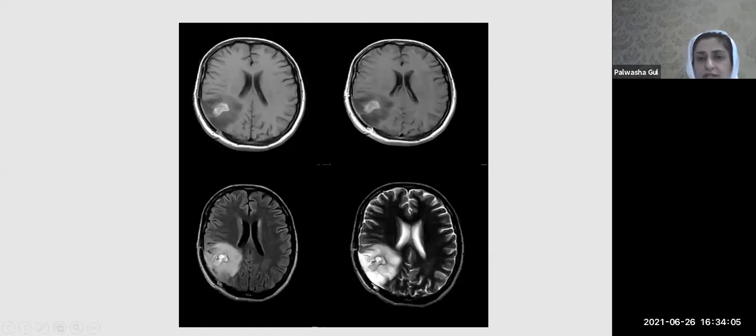Okay, so this is absolutely wrong. I keep on saying, look at T2 signals, okay? T2 dirty signals. This whole is a glioma. So maybe the neurosurgeon went with the purpose of maybe doing a biopsy or debulking, I do not know. But just this much amount of tumor was resected, okay? And this whole was left, okay? So this is not edema, okay?